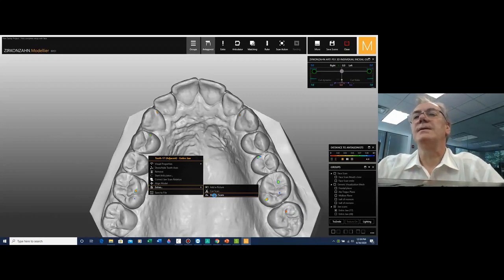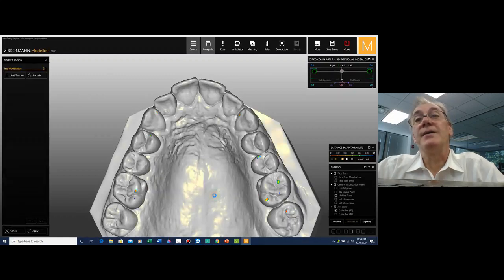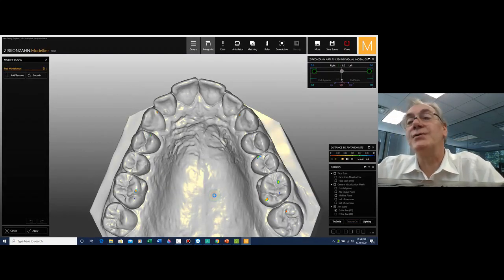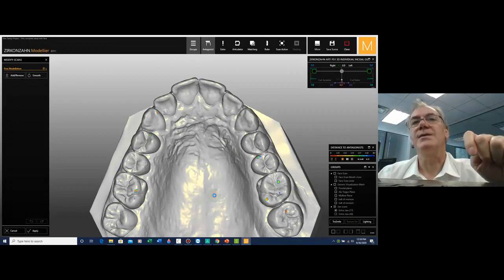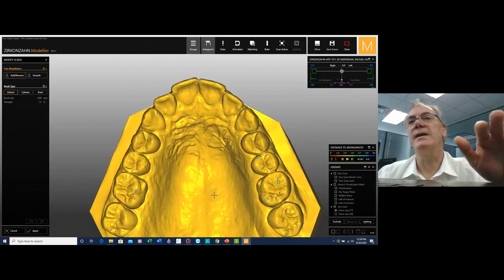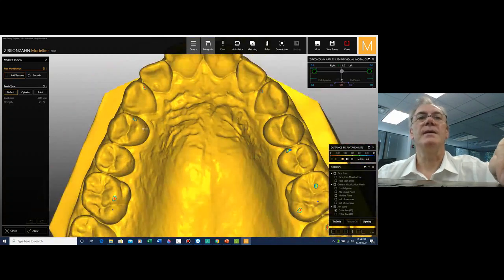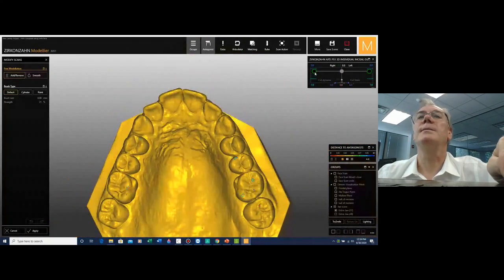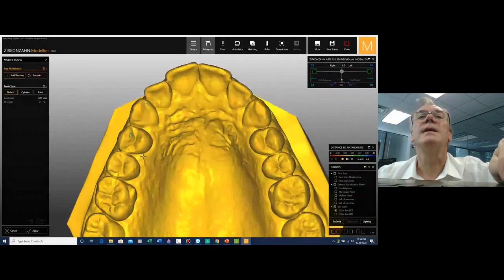Yeah, it's a little bit slow today. And if it's something that we don't do now, Mother Nature is going to do it slowly over time, creating a huge trauma to the tooth itself. So sometimes it's really worthwhile evaluating these odontoplasty treatments. So let's see where we are standing. I'm coming over 1, 2, and it starts hitting. Let's take it away.